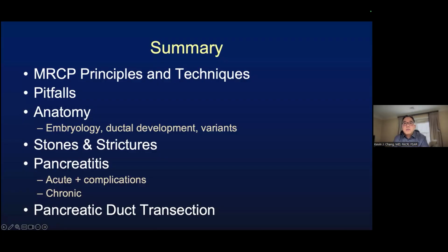In those cases, especially if they're associated with areas of T2 signal heterogeneity, you can raise a suspicion for hemorrhage. In fact, it's a diagnosis that I get more suspicious of on the pre-contrast images rather than the post-contrast images. Post-contrast images can often mask the findings of hemorrhage because the other structures around there, including the pancreatic parenchyma, enhance as well. So it's definitely something I see more easily on the pre-contrast images.